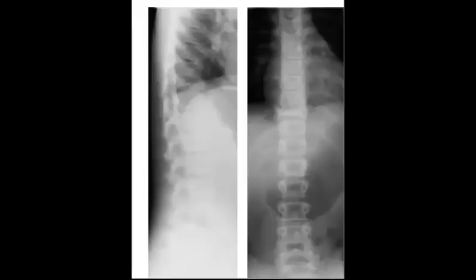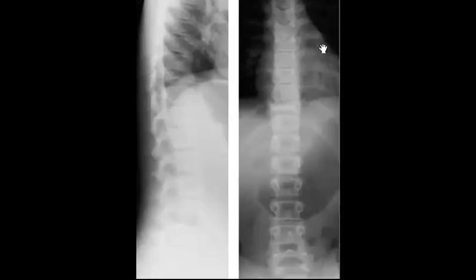I think this one we discussed many times, but let's try to describe. So you start with the radiograph, which is here the frontal and lateral radiograph of an immature skeletal patient or pediatric age group patient. So you have what is called vertebra plana in this age group. So one of the most important diagnoses to consider is eosinophilic granuloma or Langerhans cell histiocytosis.